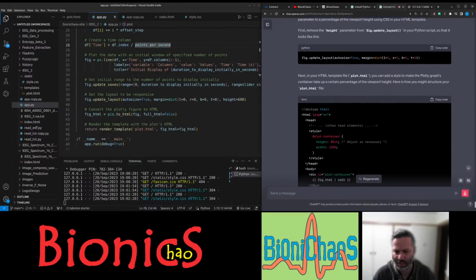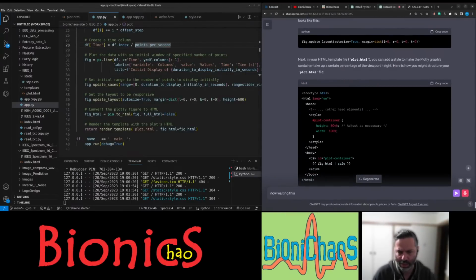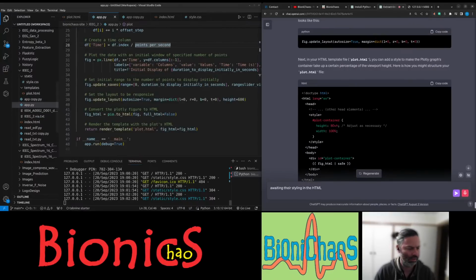Now let's add the styling in the HTML. Okay, we've got 9 minutes, 8 minutes.